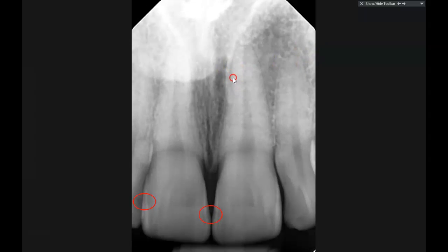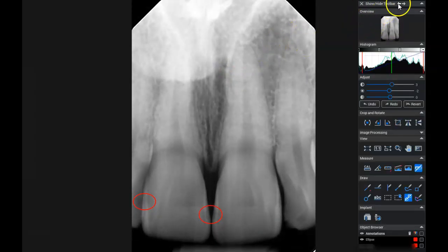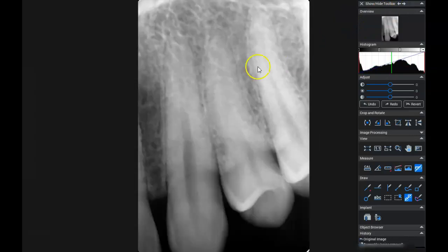The other thing is that occasionally, in scrolling through, the large image in view does not match the thumbnail to be edited.